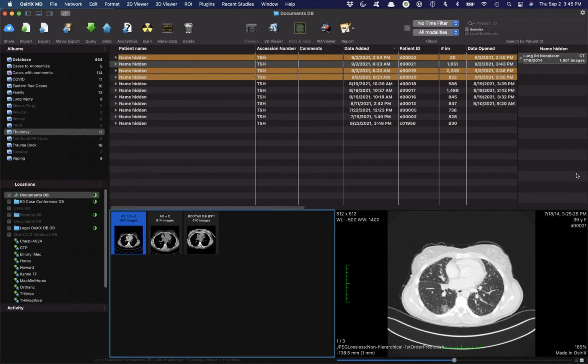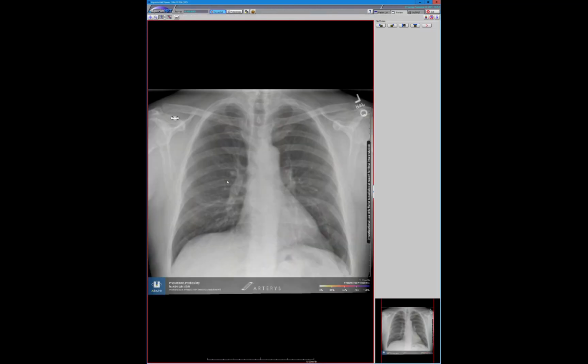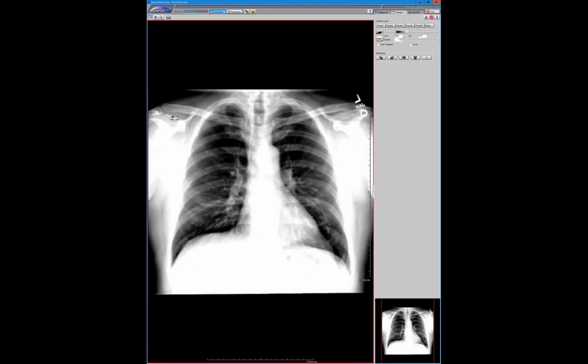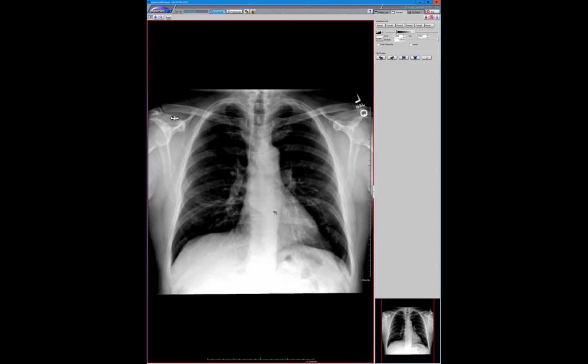Okay, this is just, I showed one of these a while back. It's just a nice example of, does this have the lateral on it? No, it doesn't have the lateral. So here, the frontal, you can kind of make out something in the subcarinal space, but I think, if you're shooting through films, you might go by it very quickly.